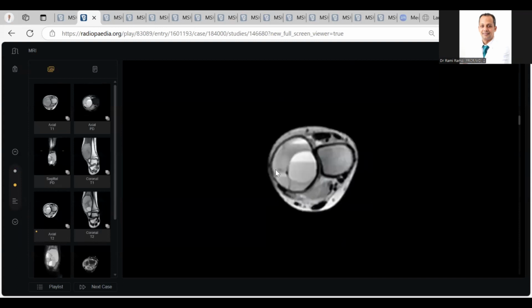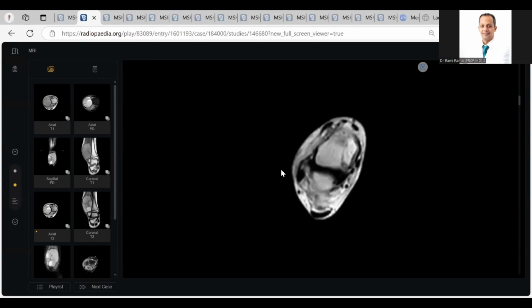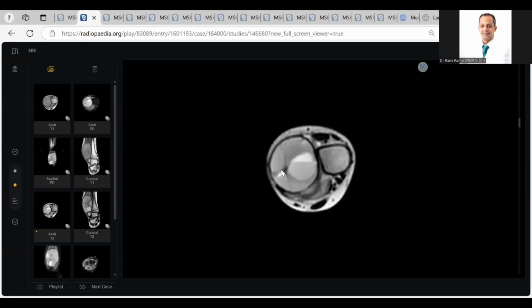This is the MRI. You asked me to do CT. In all MSK cases, ask for MRI, except if you have a doubt or a differential diagnosis such as osteoid osteoma. Otherwise, ask for MRI. This is MRI showing multiple fluid levels in an expansile lesion. These fluid levels are because the aneurysmal bone cyst is made of multiloculated blood-filled spaces of variable size separated by fibrous septa.